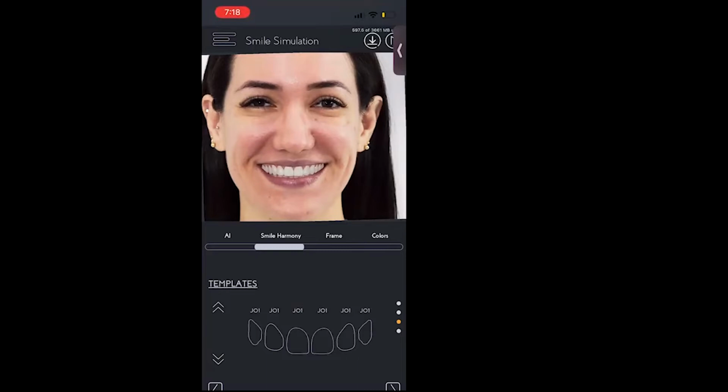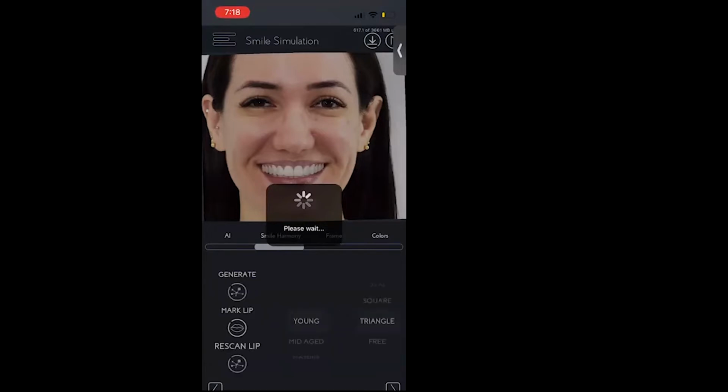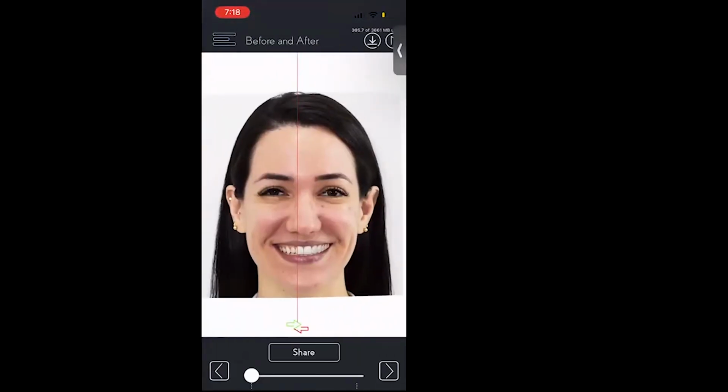Once my patient understands that rather than doing just those two laterals, I can also perform an entire workflow, a more beautiful, more harmonic smile for her, I can then move on to the next step. And that's what happened to this patient.